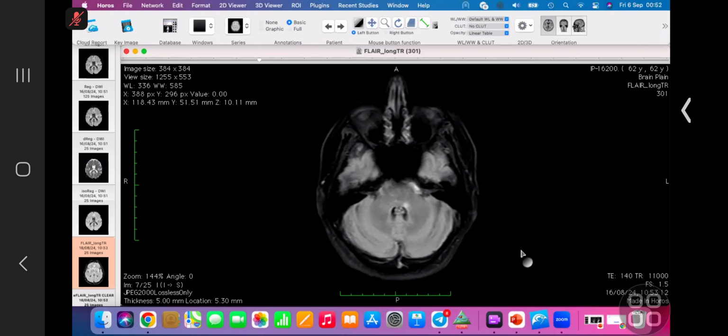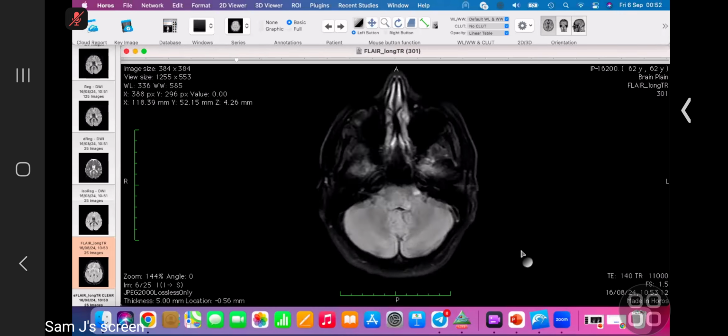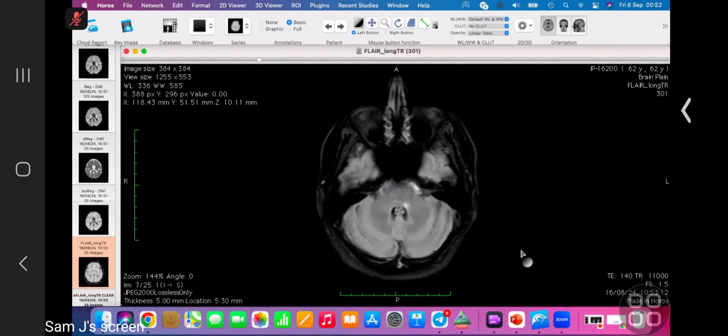Yeah. So let me take over this case. It's a very interesting case actually, and like I say, this is going to test your anatomy. If you get it, full marks for you. So this area is nothing but the tegmentum of pons, and the classic history which I said was nothing but facial collicular syndrome. So patient had the typical conjugate palsy that is involving the abducent nerve and also the facial nerve. So these two are very critically arising and traversing through this pons.